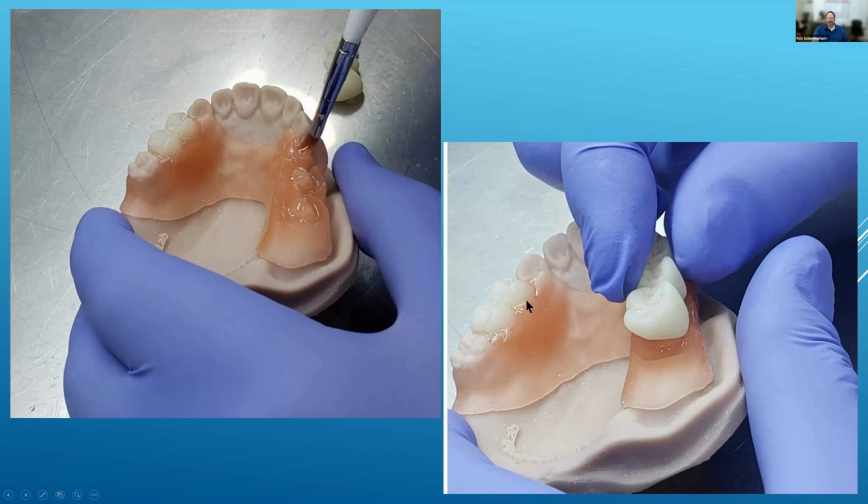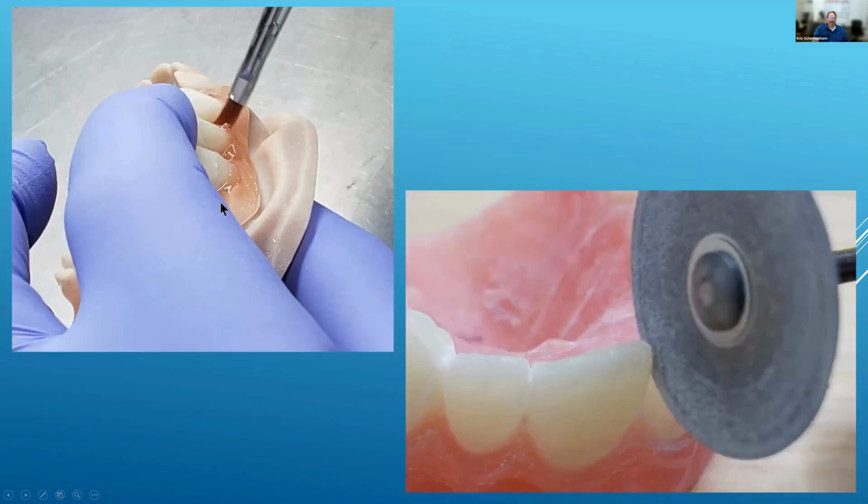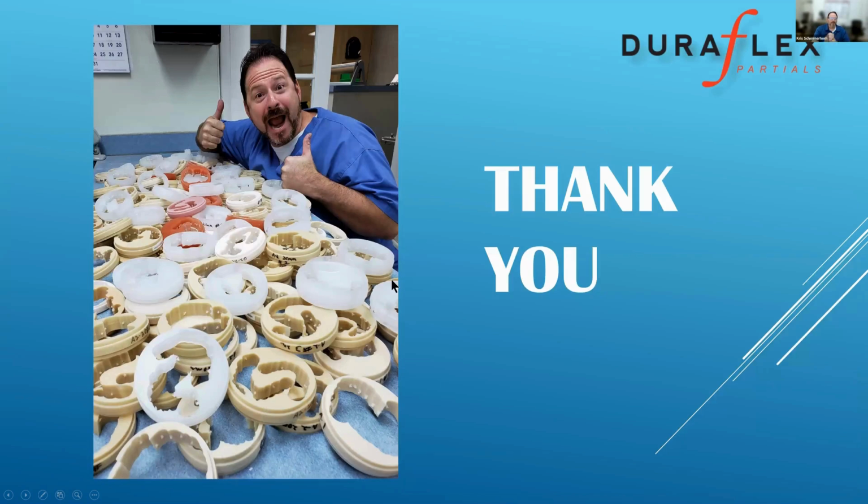And so this process isn't any different than doing a denture. You paint it into the space, work it into any of the undercuts, put your teeth down in place, clear out the excess, tack it with a light, and then send it through its final curing stage with the bonding agent in place. Nice thing about the DuraFlex is it's translucent, so that curing light will penetrate and do a good job at curing that.